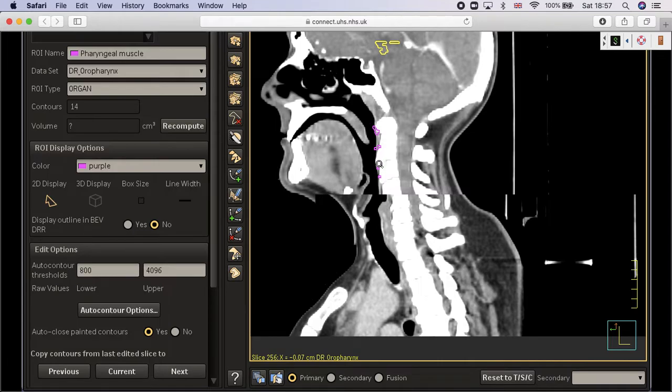And that's why I would prefer, I would say, just do it continuously, and that's it. And I think the SORO guidelines told us, just for simplicity, and for practicability as well, just draw it as one piece. Some people will take the hyoid bone as a landmark. I wouldn't do that, because the position of the head is different, honestly.